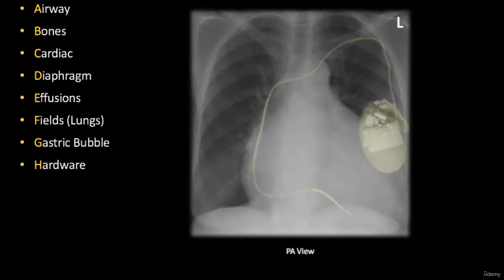If patients have any devices in their bodies, such as nasogastric tubes or electrostimulators or EKG electrodes attached to the skin, of course, all these devices will appear on the X-ray too, and it will allow us to check whether they are installed correctly, whether they are in the right place or not. So this is one more point to focus our attention on.